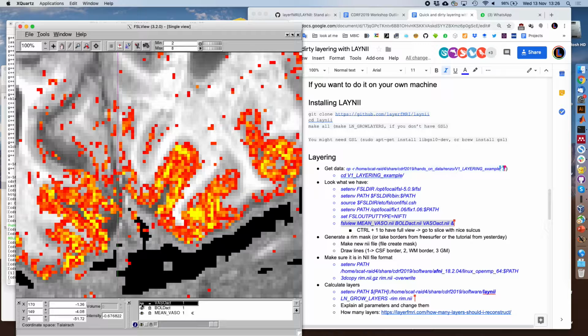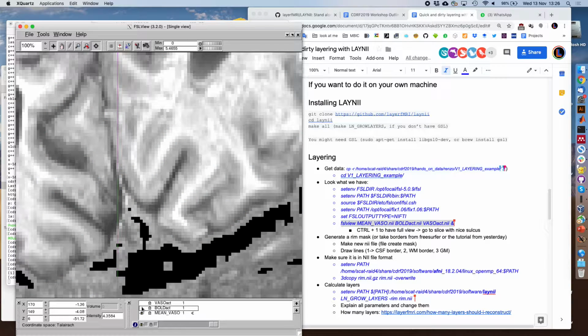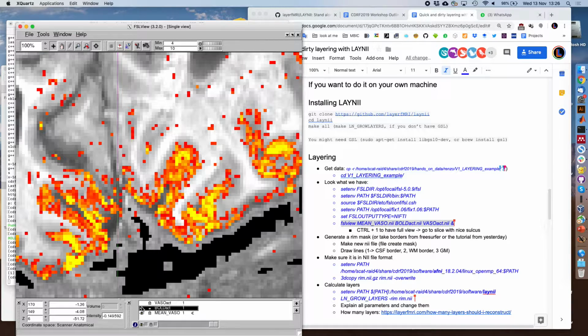What's the task here? It's just a flickering checkerboard, full field, as big as the screen was. Yeah, 30 seconds on, 30 seconds off.